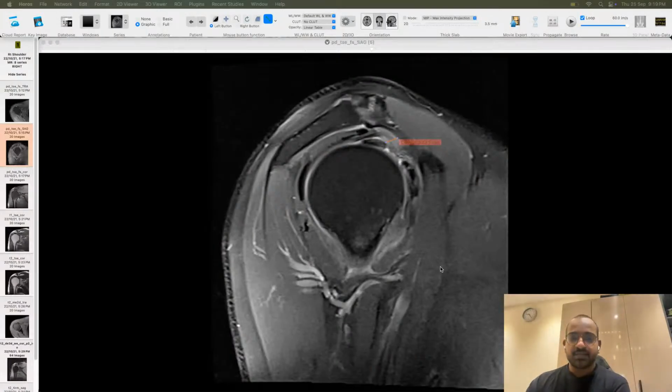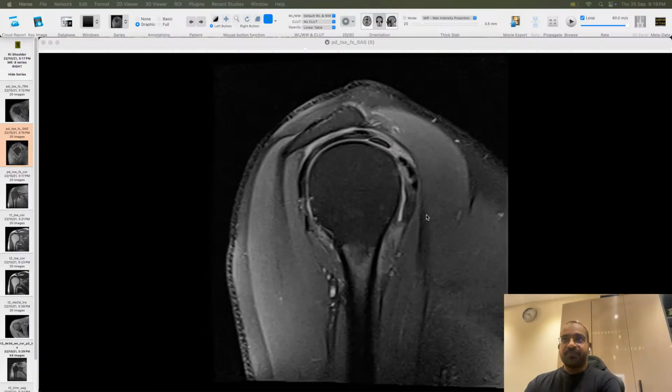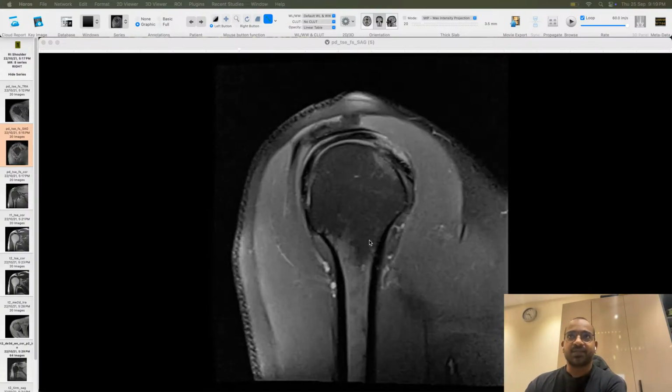So we are at this point. There is thickening of soft tissues surrounding the long biceps tendon in the rotator interval. And this is a thickened coracohumeral ligament over here. So these are all the signs of adhesive capsulitis or periarthritis shoulder or frozen shoulder. So this is done. Are we missing something in this case?